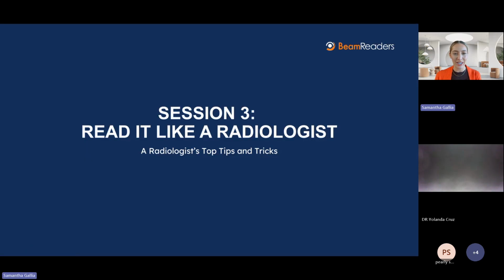So today's session is Read It Like a Radiologist. It's going to be a radiologist, that's a tongue twister, top tips and tricks. So we're going to go through a little bit about how I review a scan and how you can start forming those positive patterns in terms of reviewing CBCT scans.